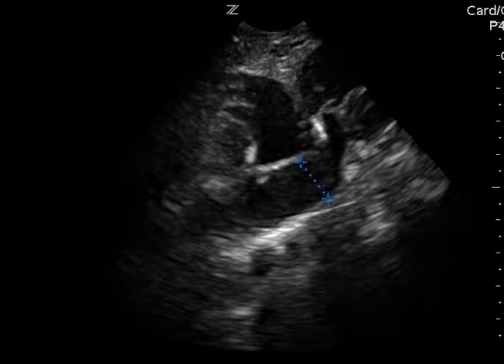The measurement of the IVC corresponds to your CVP, which has been pretty much debunked pretty significantly in many papers and in a lot of studies. So I think measuring it, whether it's a half a centimeter, 1.5 centimeters, doesn't help. I think what does help is if it collapses or not. If you have that the IVC completely collapses, I think you could safely give a patient volume.